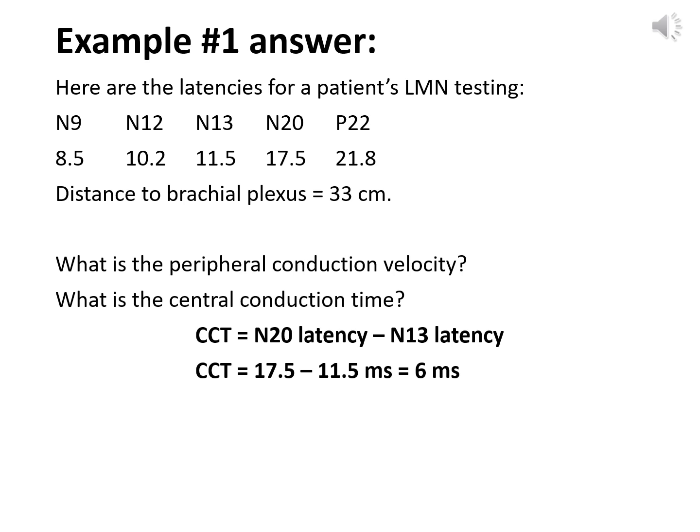And so the travel time is the subtraction of the latency of the N20, which is 17.5, minus the latency of the N13, which is 11.5. Subtracting them gives us an answer of 6 milliseconds as a central conduction time.